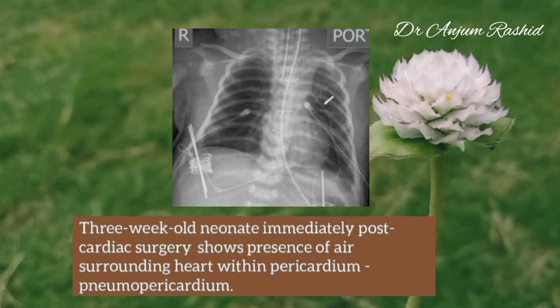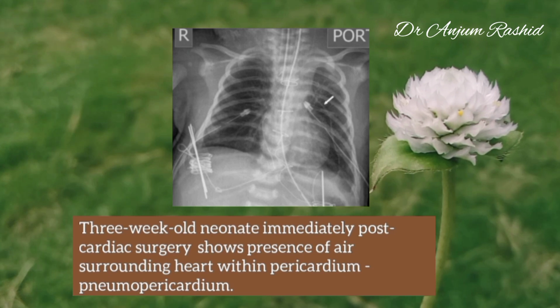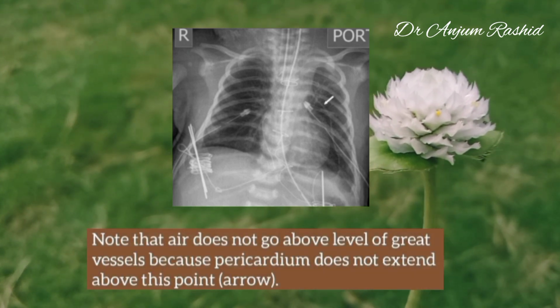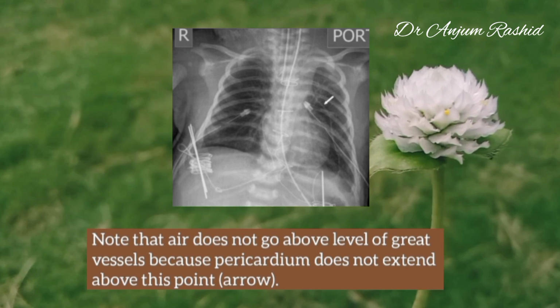Now, this is a chest X-ray of a 3-week-old neonate immediately post-cardiac surgery. It shows presence of air surrounding the heart within the pericardium, that is pneumopericardium. Note the air does not go above the level of the great vessels because the pericardium does not extend above this point.